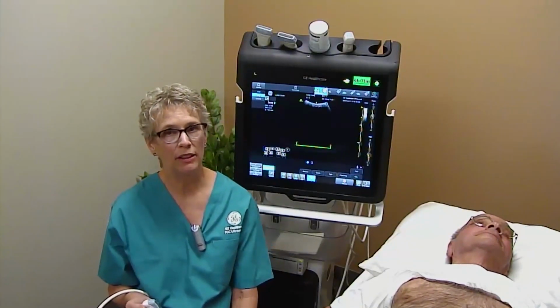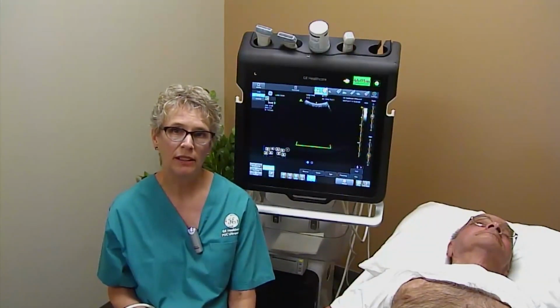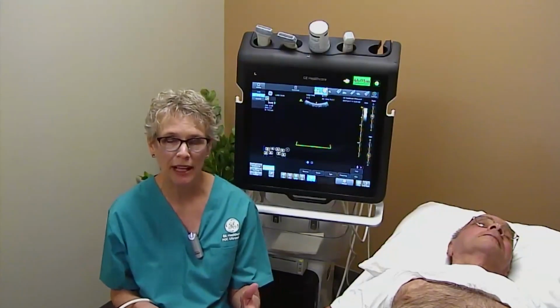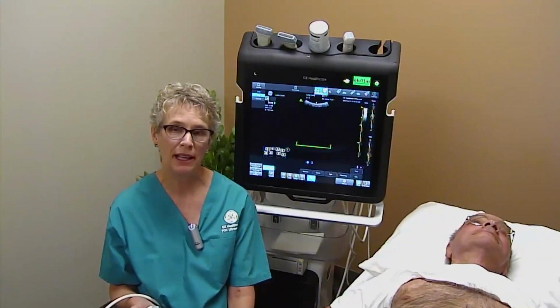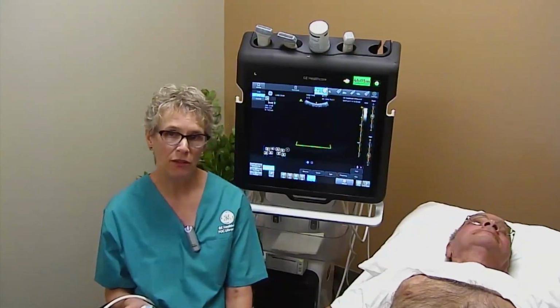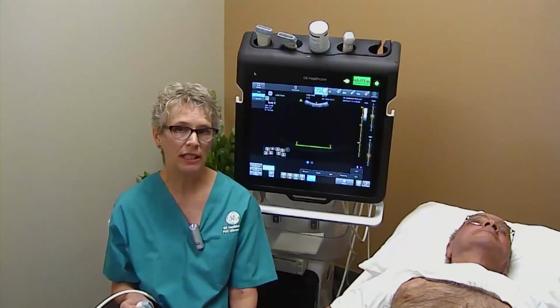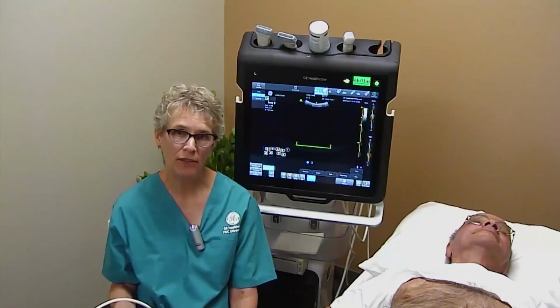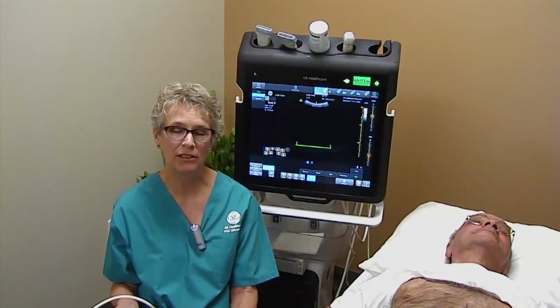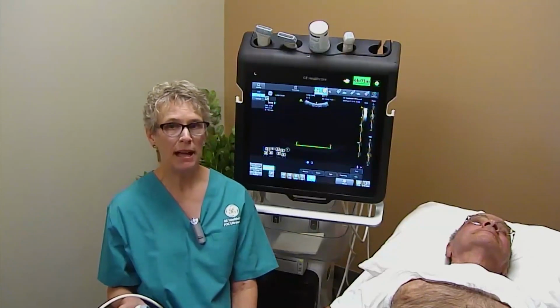In general, you'll find that there are these two different camps with two different points of view on this, and they're not going to sway to the other side. So the standard in the emergency department is really the across the ribs approach with the bat sign. But in some ICUs and critical care units, you'll find groups of CCU physicians who will prefer to scan along the ribs. The reason for that is because they want to see a longer extension of the pleura. They're really evaluating that, and they want to see as much of the lung as possible as opposed to really just counting within that.